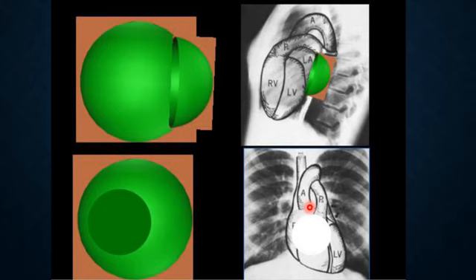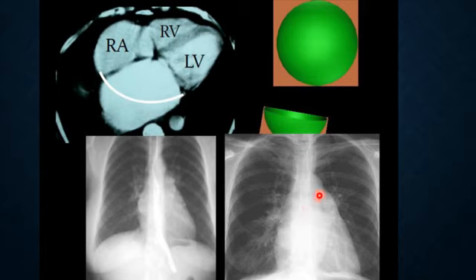Okay? Another way to help us understand it better. This is the right ventricle, the right atrium, the left ventricle, and the big left atrium. Okay? When you see this en face, you end up with this, having a density over the cardiac density. Double density sign. Okay? Double cardiac shadow sometimes is also seen. Sometimes only the right border of the heart is involved. When you see the left one also, it's called the double density sign. The same principle applies to both conditions. Okay?